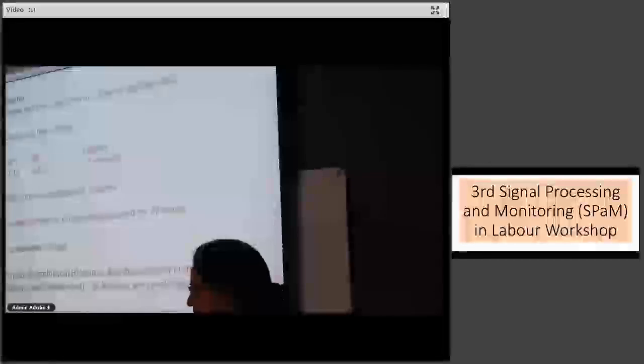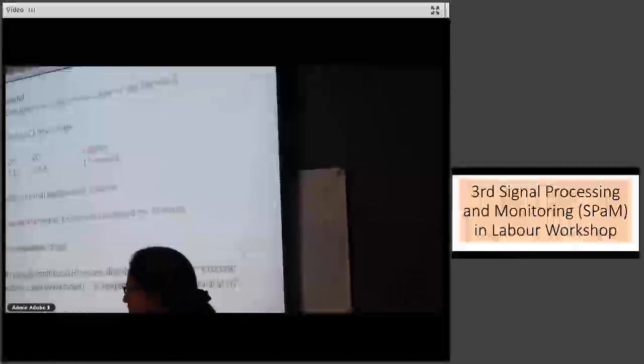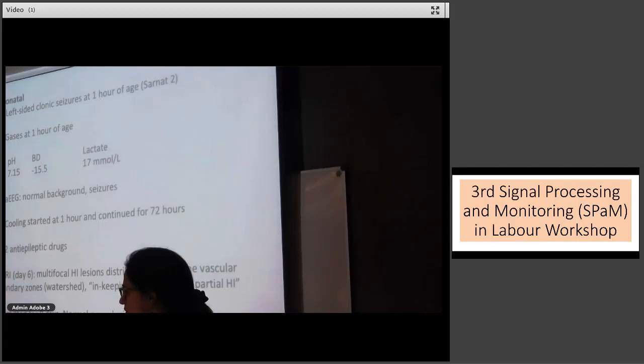For me, I would love to hear another explanation of this sequence. Okay. And if you're willing to time it, it is implausible that this baby was injured at the onset of this labor. And we see for how long this baby is resilient. And at the end, there's simply too many contractions, too much pushing, contractions closer together, heart rate's going up, decelerations getting deep, variability is disappearing, and all of a sudden at the very end we're now 180 flat, and you can see the change in the pattern. So timing is hours before delivery.